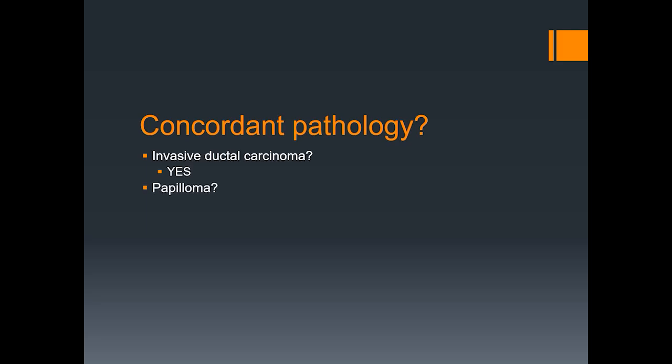Would you accept a papilloma? I would argue yes, you could accept a papilloma. She wouldn't necessarily have to be symptomatic. A papilloma in a postmenopausal patient may or may not have irregular borders, may or may not have vascularity, and could have this morphology and these findings on both mammography and on ultrasound.